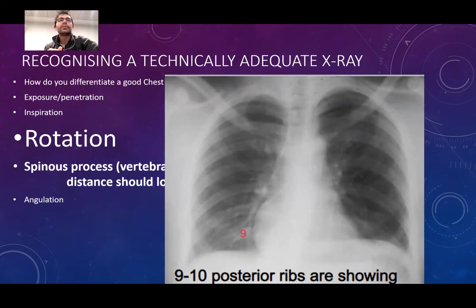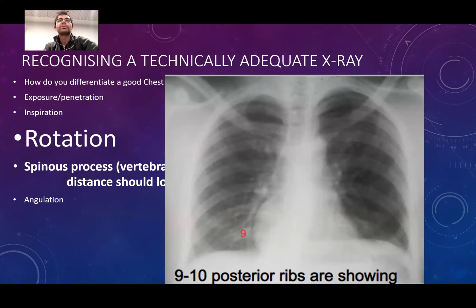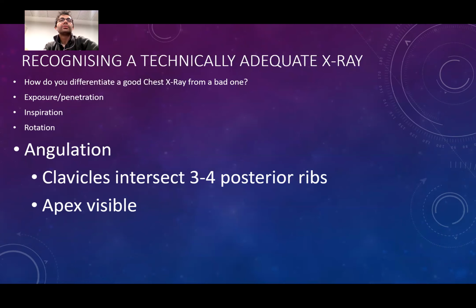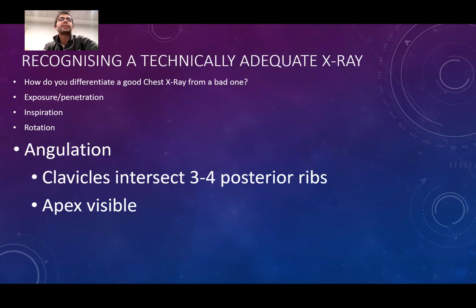What about these? Okay, I didn't mention the rotation in the other axis. Let's go over that one as well. So we have been evaluating the rotation on the left-right axis, right? If the patient is rotating to left and right. Also, there is the rotation in the other axis. If we are looking from below the patient or above the patient, that can marginally change our findings as well.